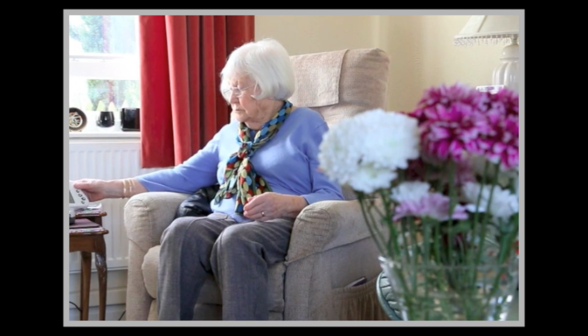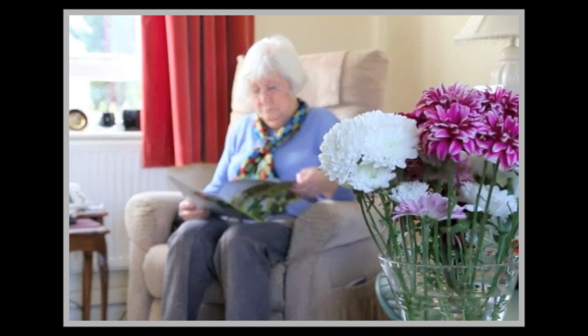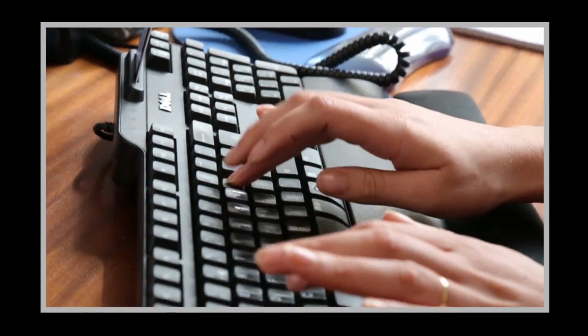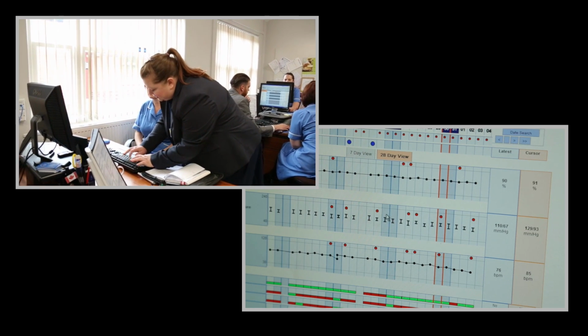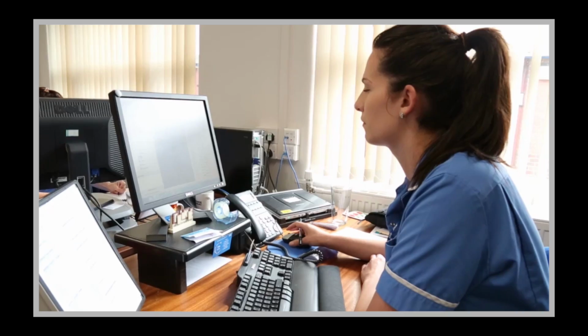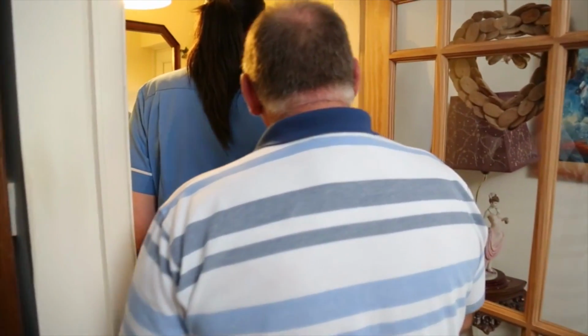Once the patient has completed their session, the data is uploaded to the server in real time. The triage team is often a combination of clinicians, although first point could be council or social enterprise led. Alerts, interventions, and outcomes can all be documented in the clinician website. Pathways will be put in place to escalate the interventions to the appropriate clinicians.